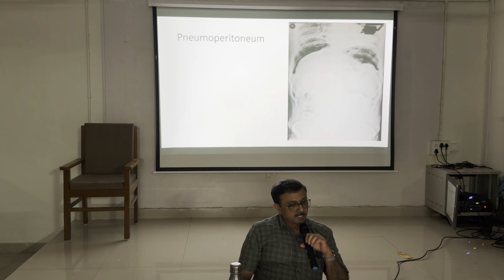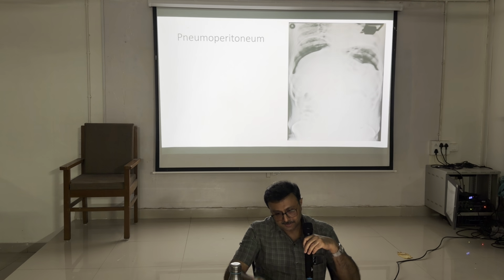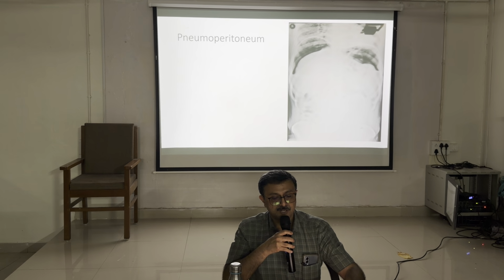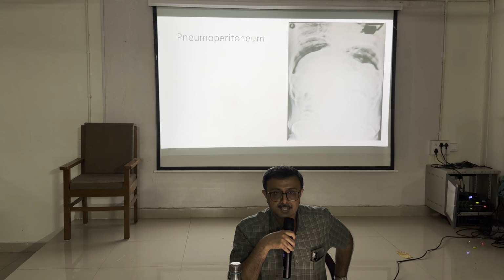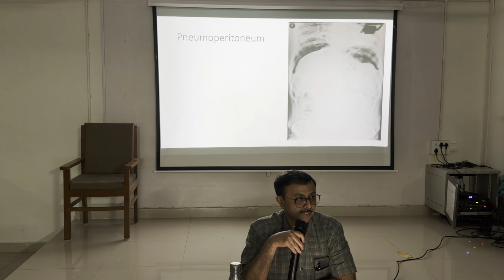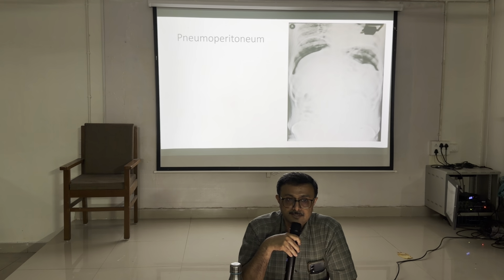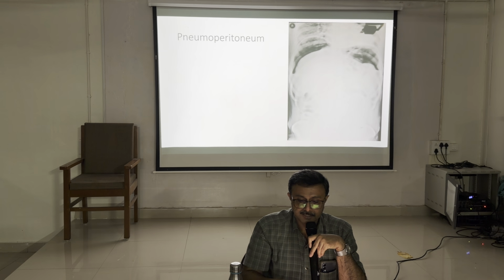Free gas in the peritoneum we can call pneumoperitoneum. Pneumoperitoneum means free gas in the peritoneum. Gas is liberated from a confined space, and that leads to which condition? Peritonitis, inflammation or infection of the peritoneal cavity.